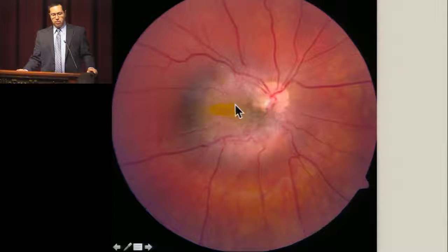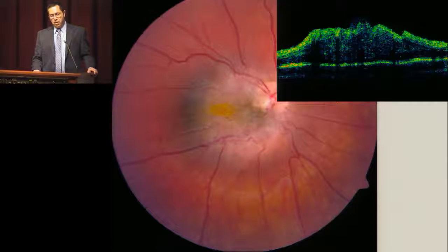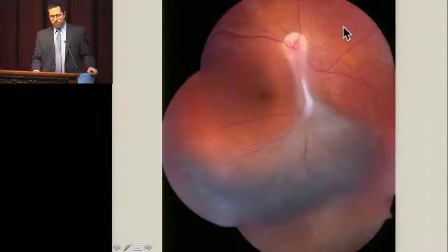You see this color. There is membrane on the surface. There is some tortuosity of the vessels, as I said, most likely because of the membrane. And you can see that it's a retinal lesion. The thickening is seen well. This is the case I showed you. Again, look at this typical color, typical for combined hamartoma. You can see the fibrosis, the traction, the foveal ectopia.